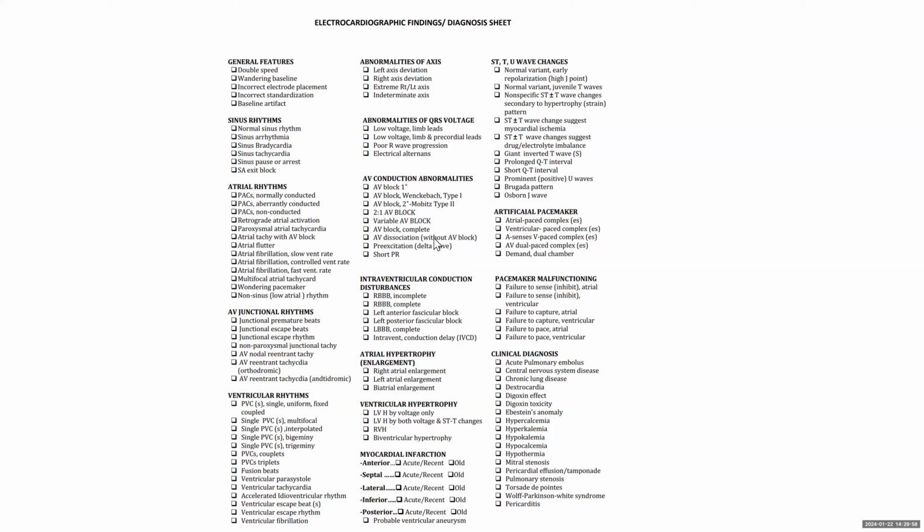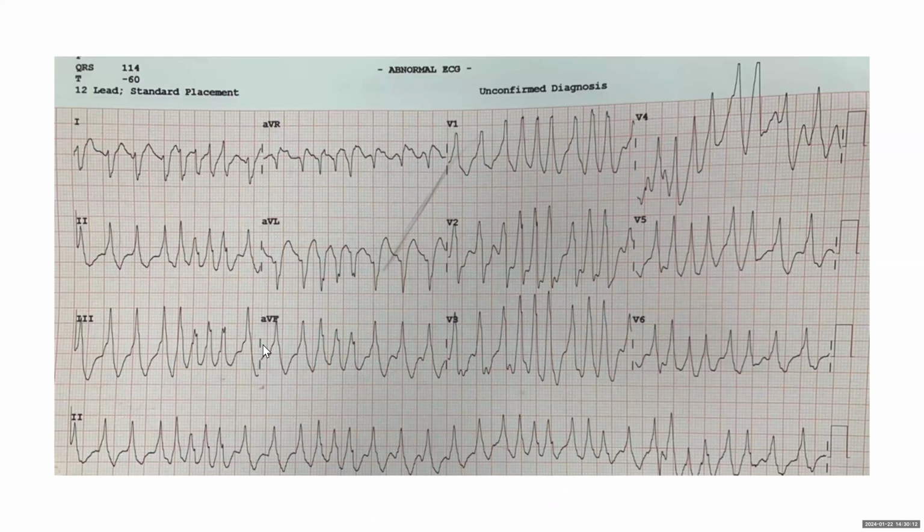You can also code WPW syndrome, right? You can also code right axis deviation, right? Because there's right axis deviation here. Yeah.